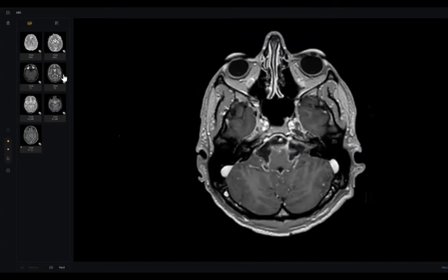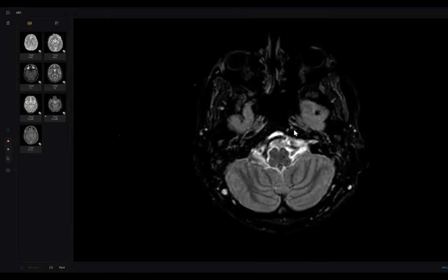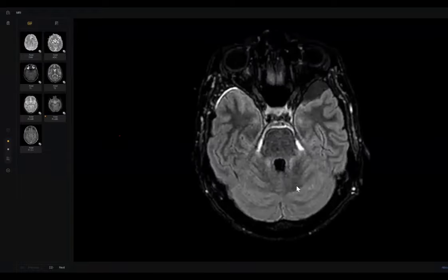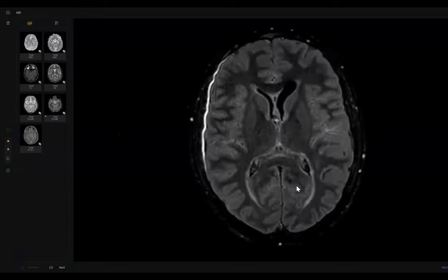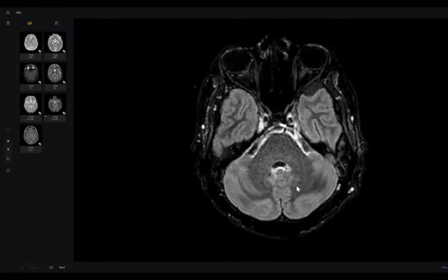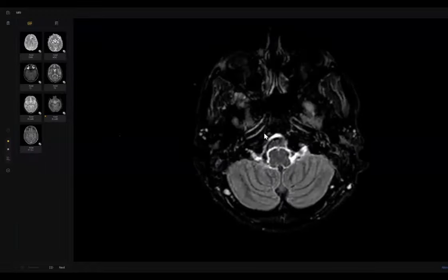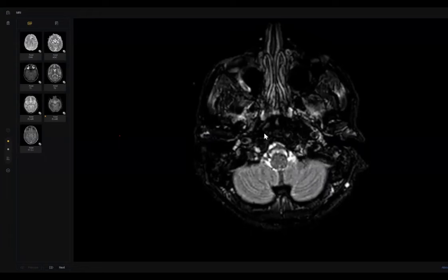Basal meningeal affection. Look here, basal meningeal, very characteristic. How could you find the basal meninges around the brainstem? Very easy. And the cranial nerves here, see the smooth signal abnormality. But here is more, the basal meninges. So it is worse with granulomatous disease, especially TB.